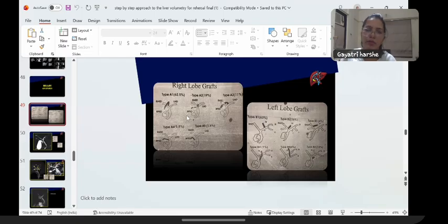Whether the portal vein thrombus is in the main portal vein, in the confluence of splenic and portal vein, or whether there is superior mesenteric vein involvement. So they have to first take out that thrombus during surgery. It is difficult, and if chronic thrombosis is there, then it is difficult to anastomose that portal vein. So we need to mention that sometimes there will be calcification in the portal vein in chronic cases.